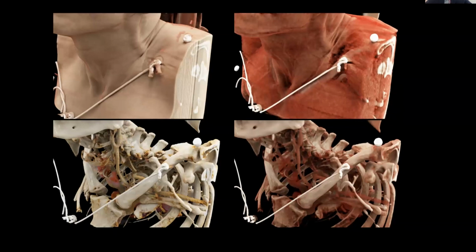Yeah, interesting. That's a great question, and it's actually quite a complicated answer. I'll do that as best I can in the next 2 minutes. First of all, I think you need to understand how these images are derived, and by understanding how they're derived, that might give you a sense of how reliable they might be.